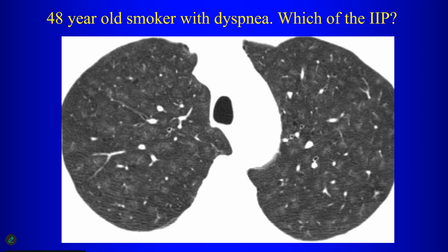The other disorder that can give you central lobular ground glass opacities that you will consider is what? Yeah, hypersensitivity pneumonitis. But if I give you this history, will you consider hypersensitivity pneumonitis? I give you that history, I give you that CT scan. Is this HP? Yes or no? It's less likely. Why? It's usually organic exposure, right? There's another important reason.